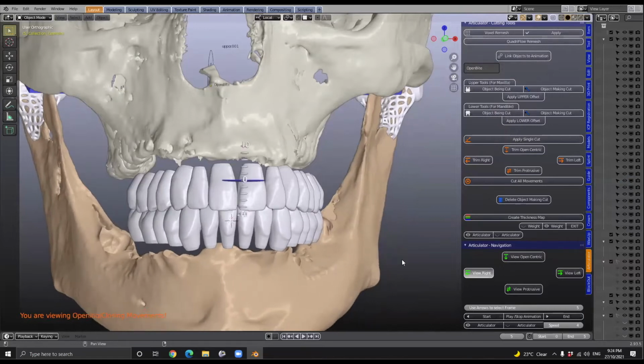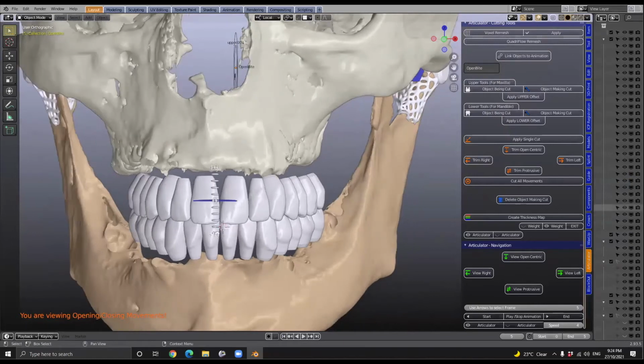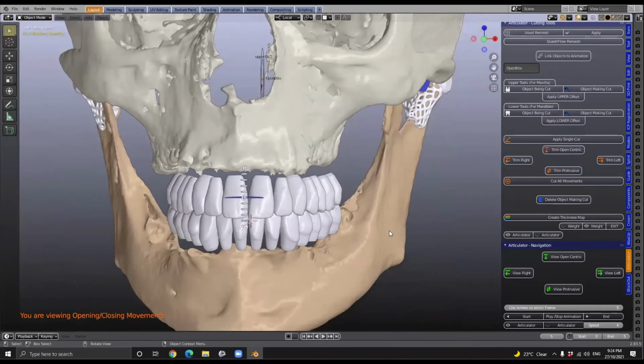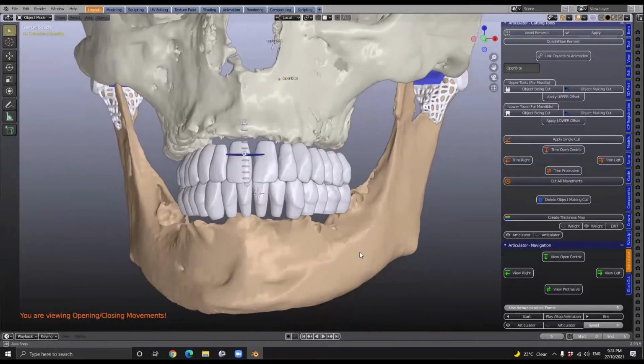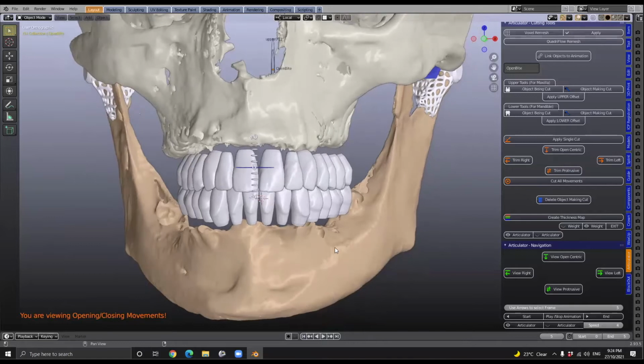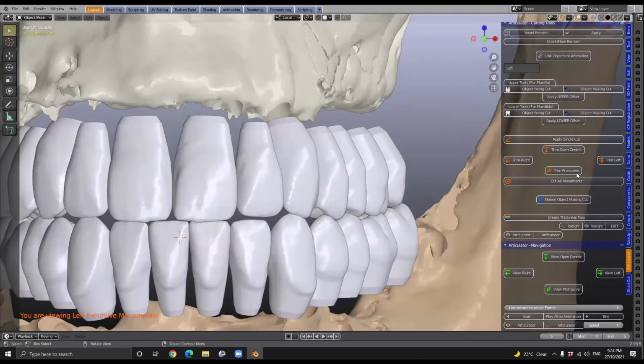Now what I want to do is edit this, and this is Wolfgang, this is what I was saying earlier. This is where we're going to come to. Now I want to cut a tooth and I will see, okay, well, I'm not happy with the way this moves, or maybe I want to change something. So we're going to go into the editing.